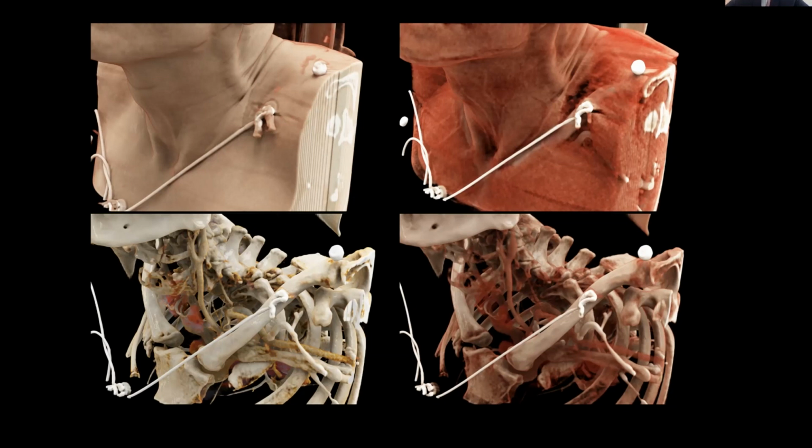So that's that. Then when you come to something like 3D representations, depending on the specific vendor and the specific software, there is a different algorithmic approach to depicting the tissue.